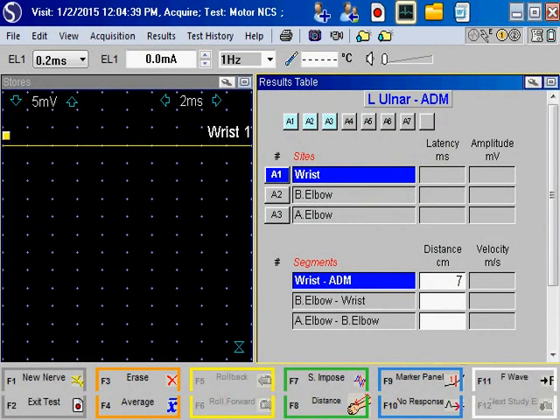Reference values or normal values. Many laboratories like to include their reference values in the test protocols. This makes it easy to identify abnormalities while testing, to highlight abnormalities in the report, and to generate automatic summary.